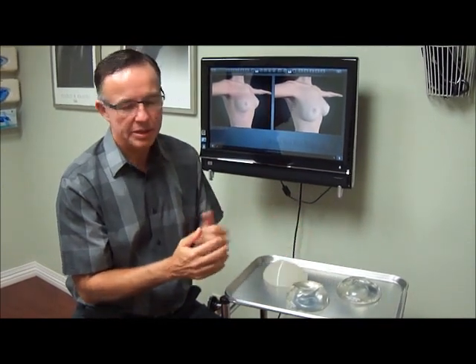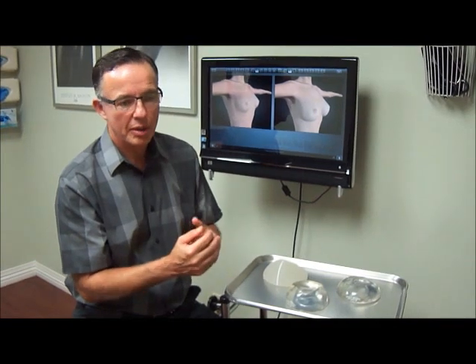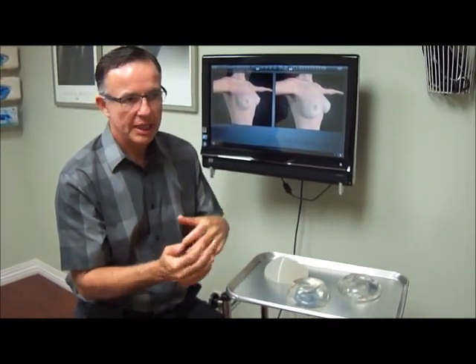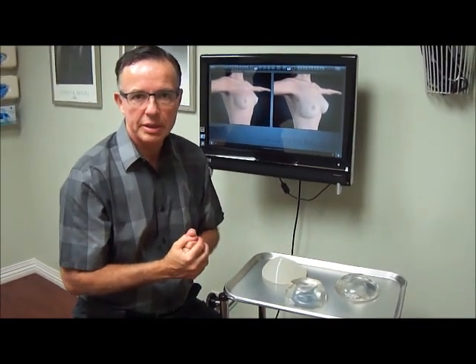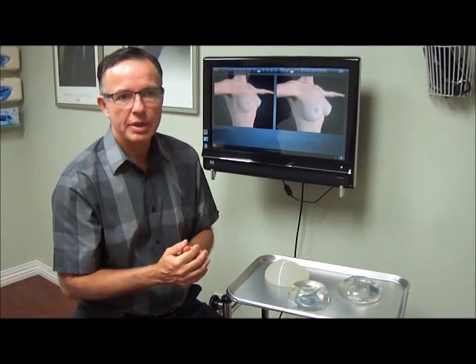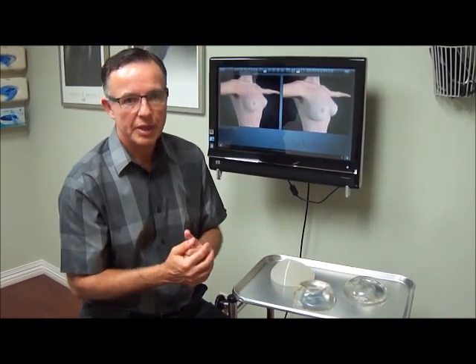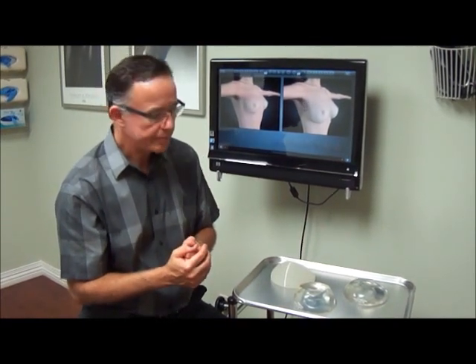And especially young patients that like to have significant projection of their breast will be a good candidate for this kind. The choice between one or the other has a lot to do with art and perception of a beautiful breast more than science itself. And sometimes they can be used indistinctly too.